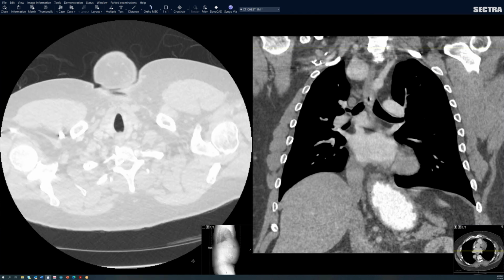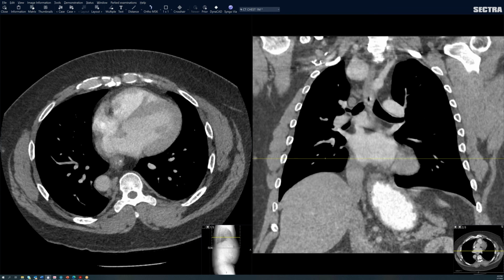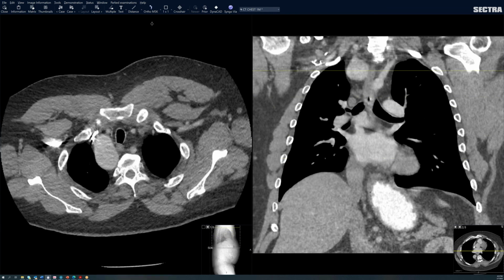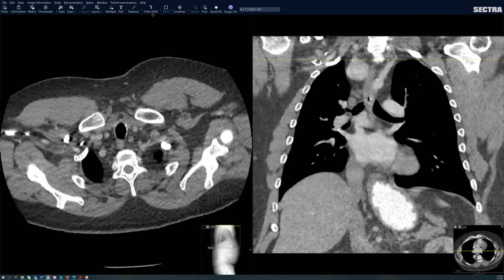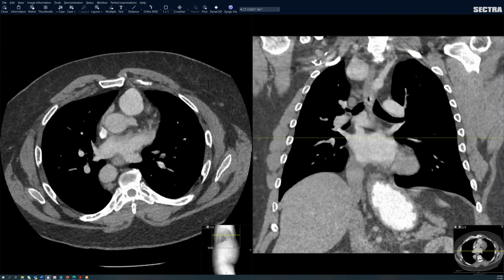It was just an interesting constellation of findings in a person who was coming in for a question of retrocrural adenopathy, which turned out to be just a dilated cisterna chyli, but who also had a vascular ring in the form of a right arch with aberrant left subclavian artery, crisscross PAs, and these very interesting looking lungs. So I'll just take a break here. If anybody has any other thoughts about this case, would love to hear.